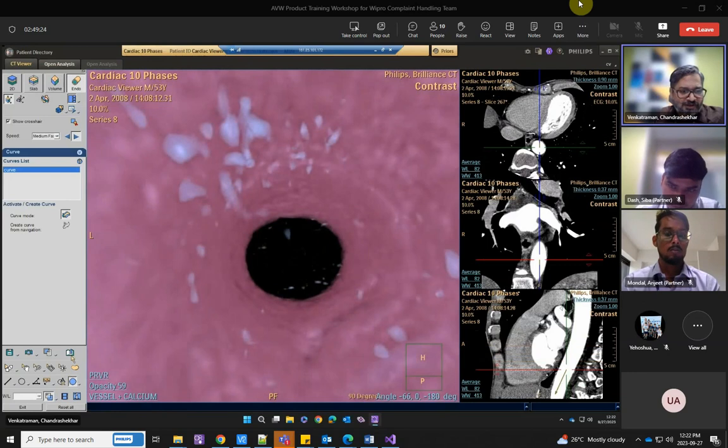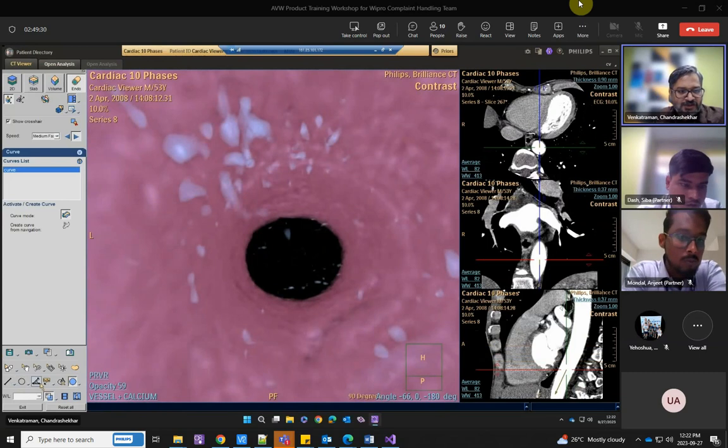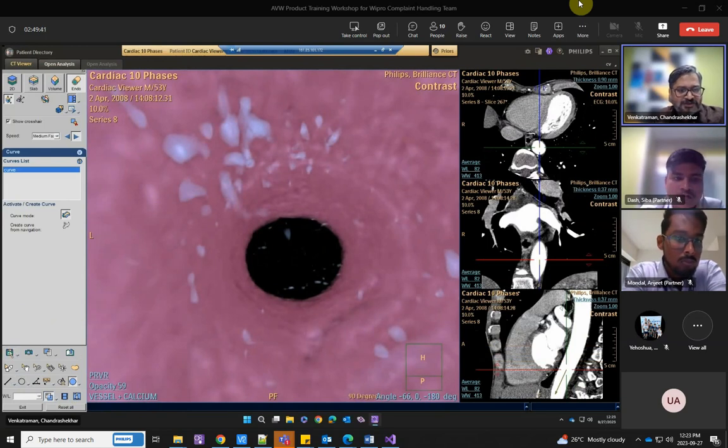Okay. Other tools, of course, are very common across all these: line and 2D ROIs, angle, all that. These are very common things. I need not cover that, I think. And even these functional tiles are very common. And of course, the usual film and report and bookmark. Of course, you guys will be familiar with that. Let me exit CT viewer.